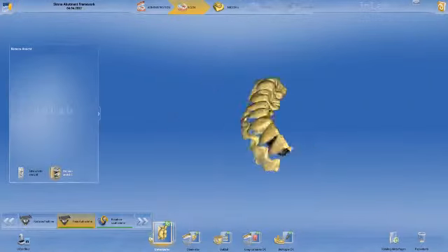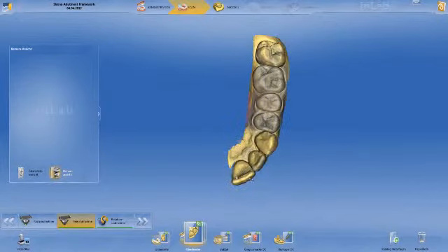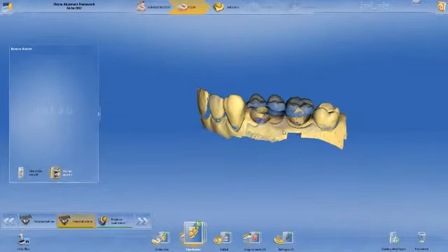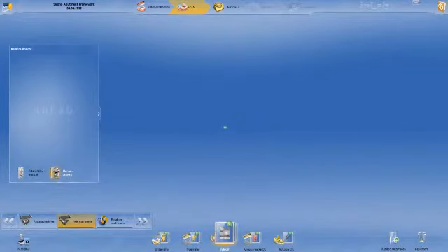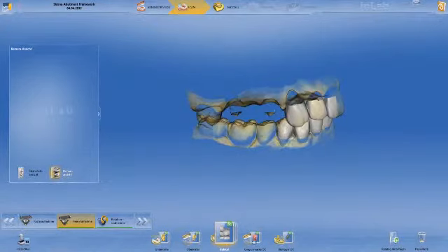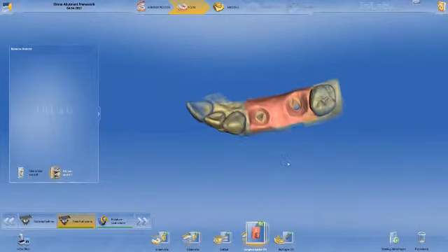In this case, the lower jaw as the opposing jaw. Upper jaw with the two scan bodies. Buccal scan in the articulator in order to register the upper and lower jaw. A gingival mask in order to copy the emergence profile on the model.